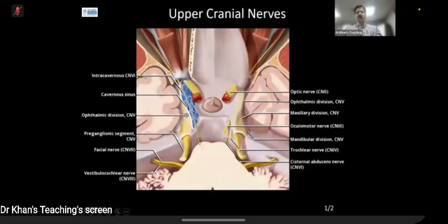Now, this is the 6th nerve, and slightly more superiorly, the fifth nerve is going anteriorly. This is the trigeminal nerve. It is a big, thick nerve, and we can see it very well on a CISS MRI scan. It goes into this part, which is known as Meckel's cave, very well seen on an MR, and it divides into three branches.